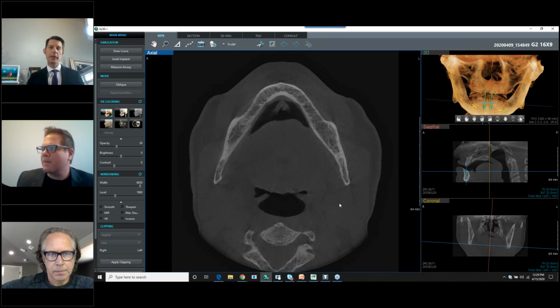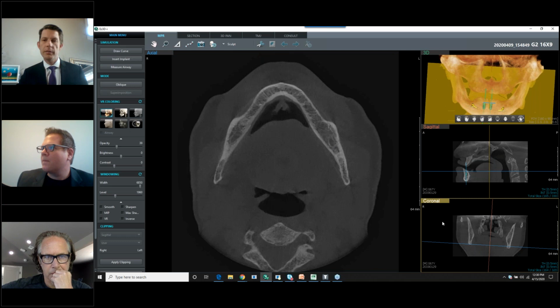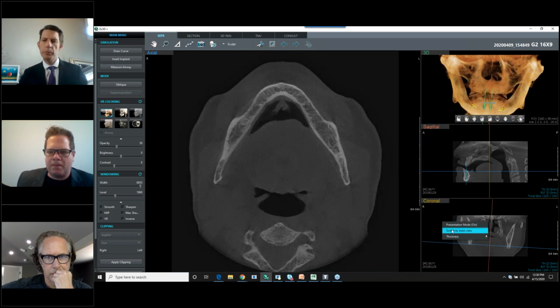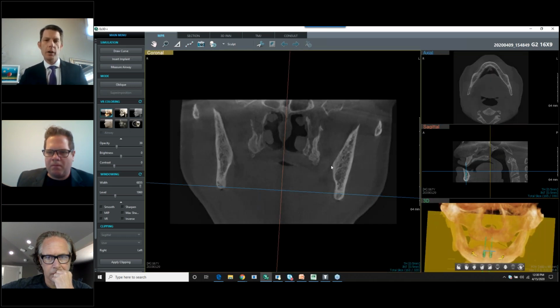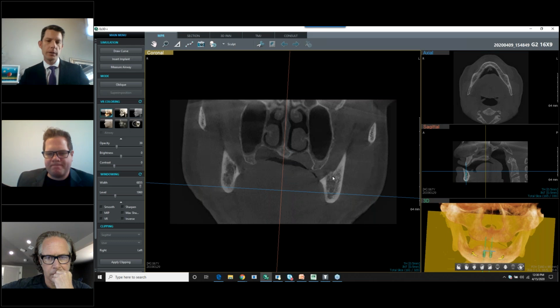Let's say we have patient movement in here. Trying to get the developers or our labs to overlay those STLs with patient movement, that is a battle. We've all seen scans where we've tried to trace the nerve, and I think we looked at this last week, patient movement, where we've tried to trace the nerve, and here I can see the nerve here, but with any sort of movement, that's going to be really difficult to view.